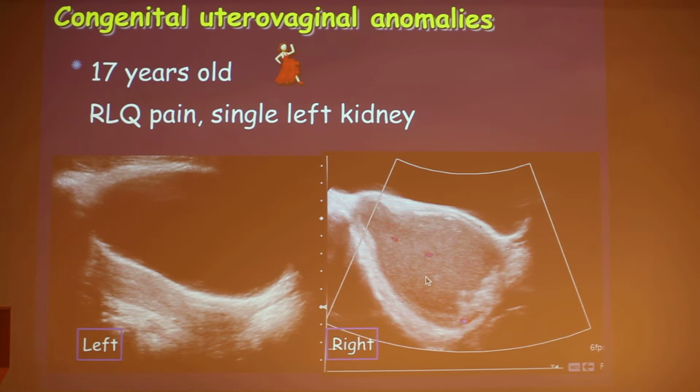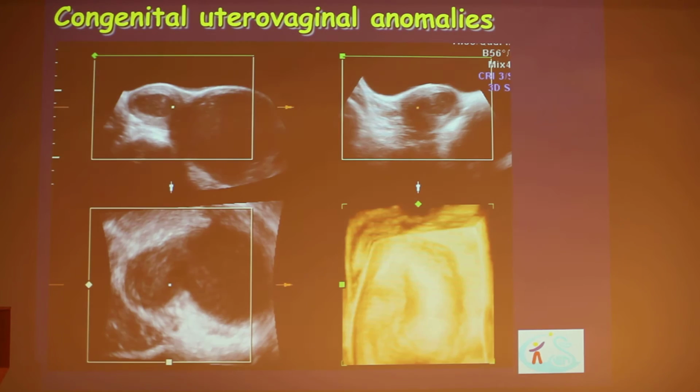Okay, this is her uterus, so this is hematometrium. This is a uterus filled with blood and secretions. She has a uterus didelphys. She has failure of the two Mullerian structures to fuse. Okay, so we told the ER doctors that that was the diagnosis, that they have to send her to gynecology. I hope there's no gynecologists here. And you know, they have to do these 3D studies. I don't know what this gives them, but that's what they did.